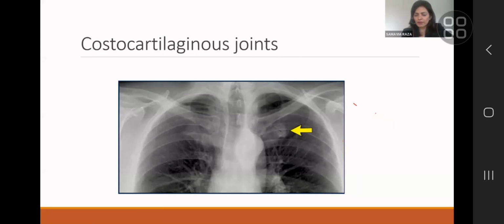And when you have a joint, you automatically have some thickening of the cartilage on both sides, and that automatically becomes permanent. So very commonly, that junction is very dense, usually denser on the right side. Extra joint is more common on the left side. Either way, this is very commonly overcalled as a nodule in the lung and generates a lot of unnecessary CT.